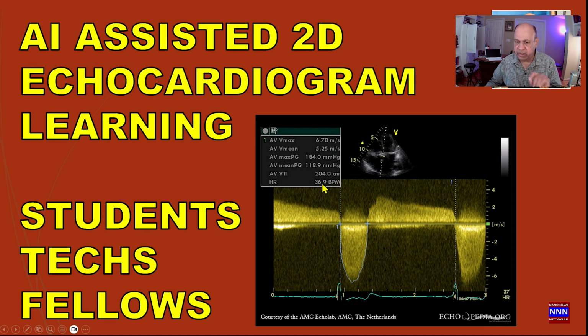So we're going to put this into ChatGPT, but I use Perplexity. So let's get to Perplexity and see what an AI search engine can do in terms of recognizing the abnormalities and in terms of interpreting this particular image, which may be useful in learning because we get a different perspective and we get a lot more parameters than what this image itself shows.